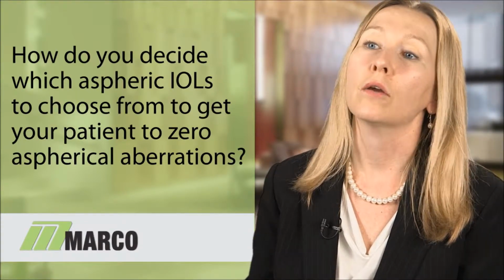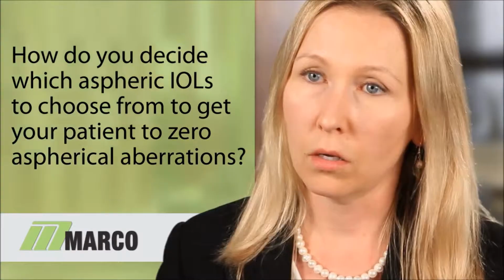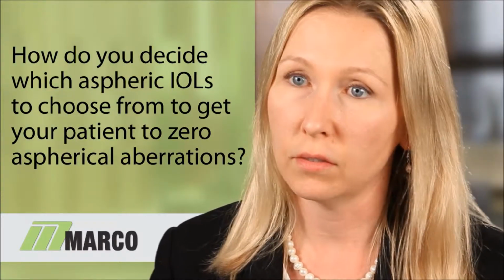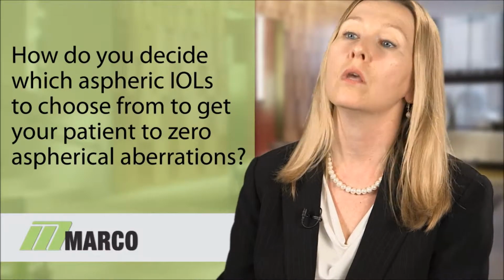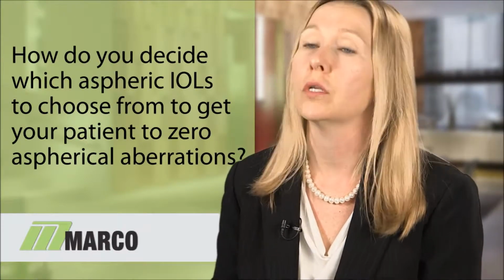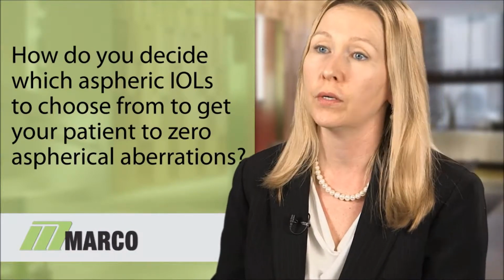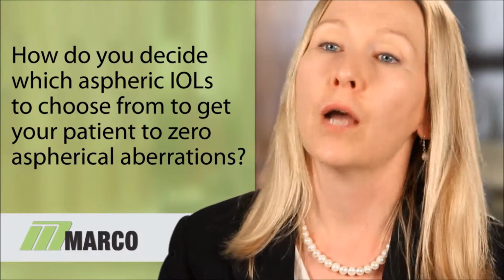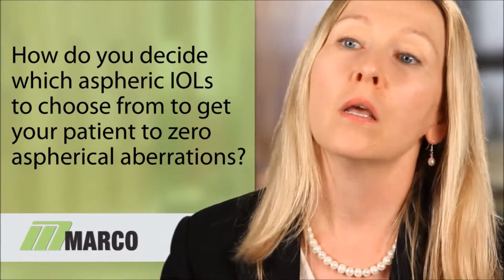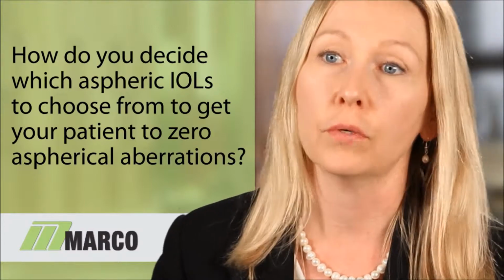And so although negative asphericity is a good thing in most cases, it does contribute to loss of contrast sensitivity, and as it did in this patient who was very unhappy. So I was able to come to this patient and tell her what the reason for her problems was, even though she was correctable to 20/20. She was offered IOL exchange, which she declined. However, she was able to understand why she was having the problem that she was having.